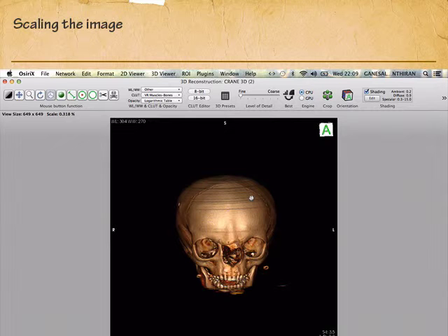Now let's calculate how many pixels are in a centimeter on this image. To do that, we put 292 pixels divided by 13.68. So what does that give? So 1 centimeter covers 21.345 pixels.